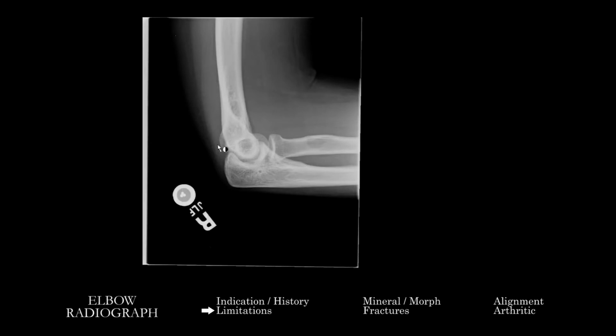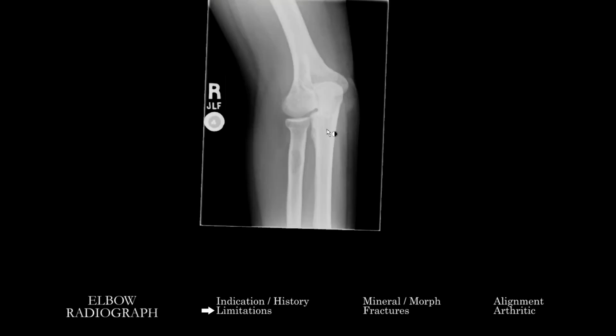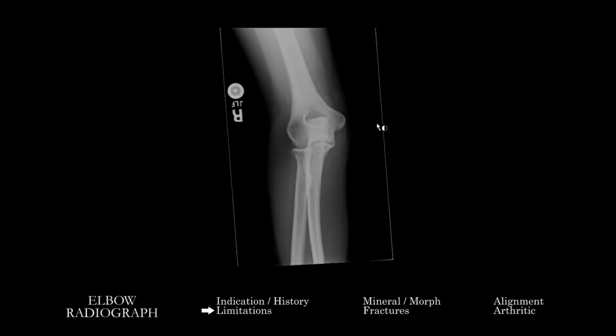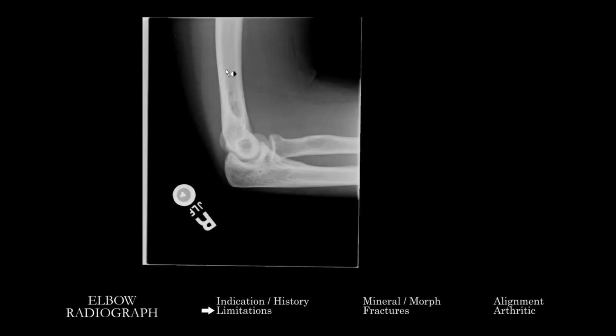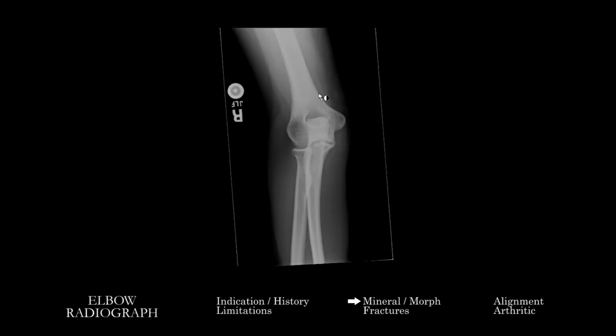You want to see that the lateral is well positioned, the humeral condyles are well superimposed, that if there was a joint effusion, you could see it, that we've got the joint centered on the image. And then, considering if we do see something that we don't really understand well, do we need additional views? And getting an overall sense of the extent of any underlying abnormality: what is the mineralization of the bone, and does that impact how we can assess what's going on?